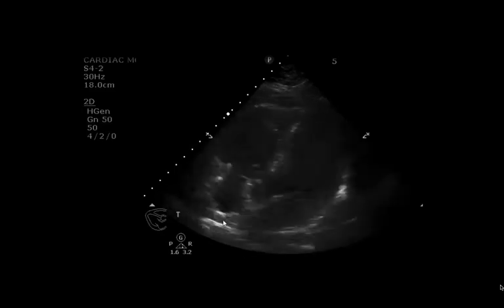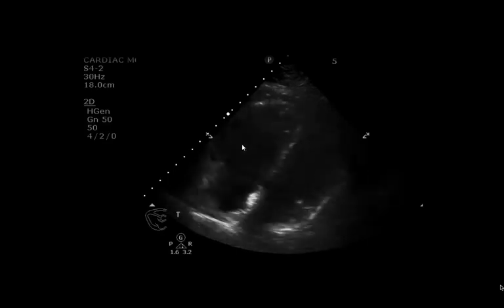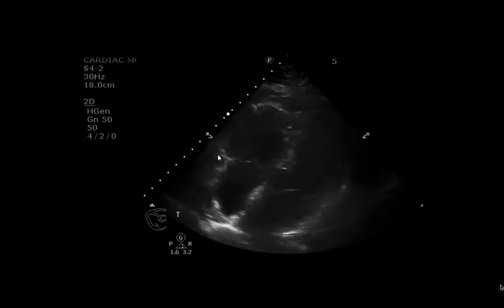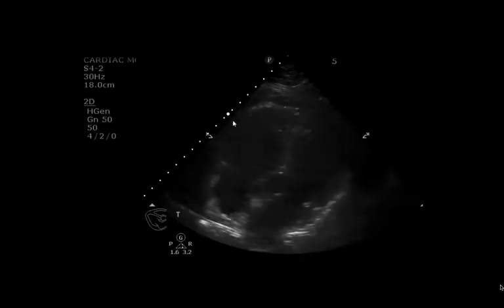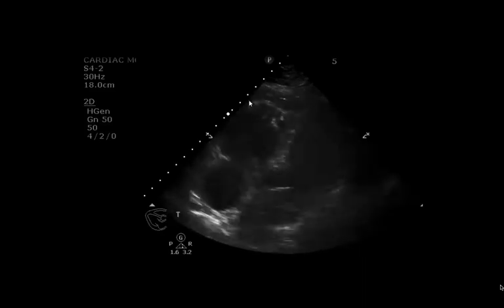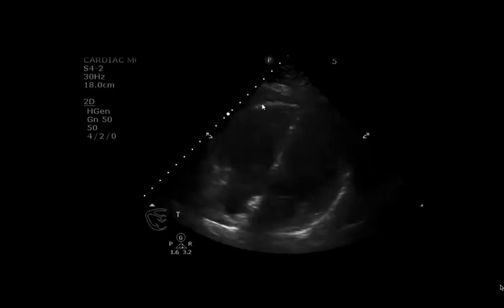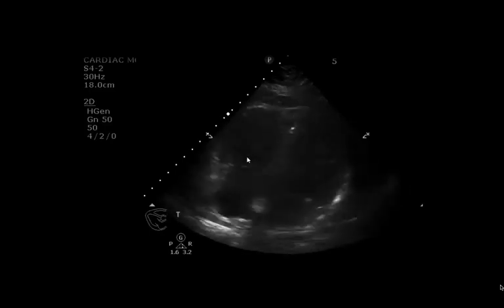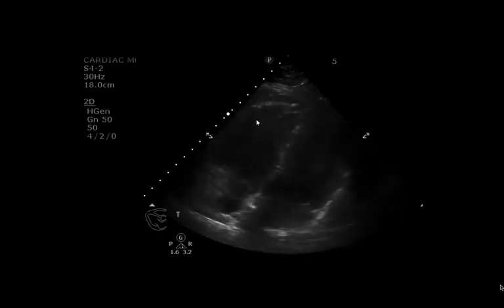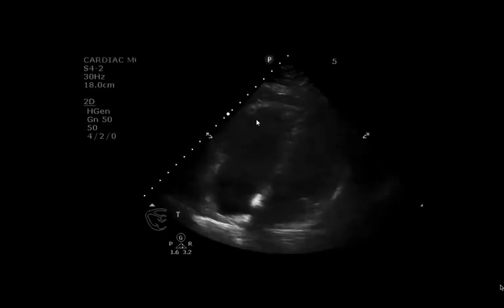For the purposes of this case, I want to focus your attention on what the right ventricle is doing. If you observe the walls of the right ventricle, you can see that the free wall, when it comes into view, is not contracting as much as, say, when you look at the apex, where it seems like all of the contractile activity is. This picture of global RV dysfunction with apical sparing is what's called the McConnell's sign and is suggestive of an acute pulmonary embolism.